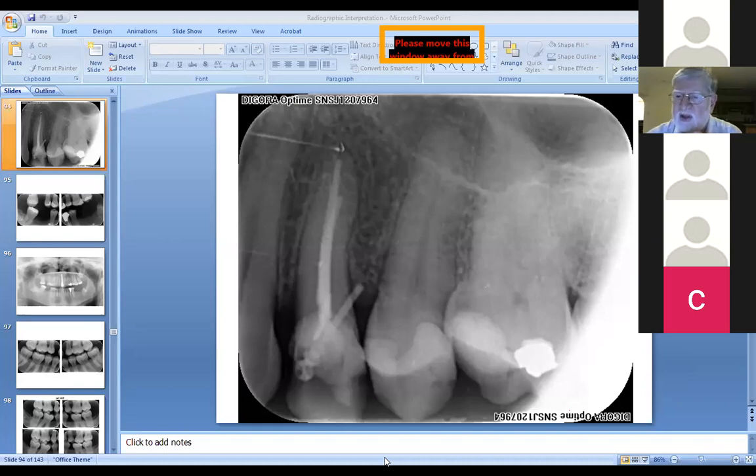Are you going to send him to a periodontist to crown lengthen? Now we're getting into doing a lot of work on a tooth where maybe an option is an extraction. But everything hinges on whether it's just going to need a filling, and then can you put a decent crown on there after?